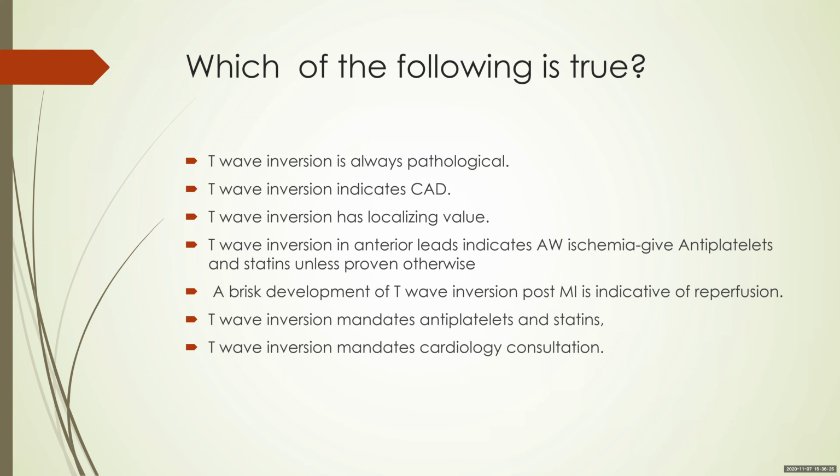T wave inversion in anterior leads is indicative of anterior wall ischemia. Give antiplatelets and statins unless proven otherwise. A brisk development of T wave inversion post MI is indicative of reperfusion. T wave inversion mandates antiplatelets and statins. Lastly, T wave inversion mandates cardiology consultation.